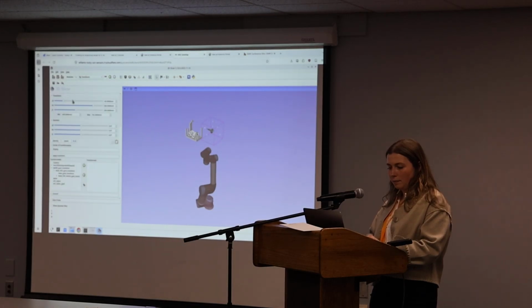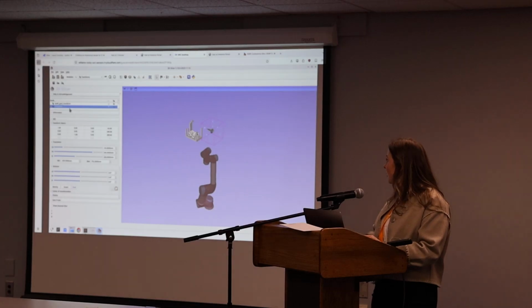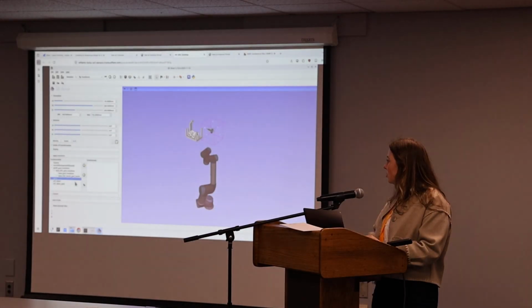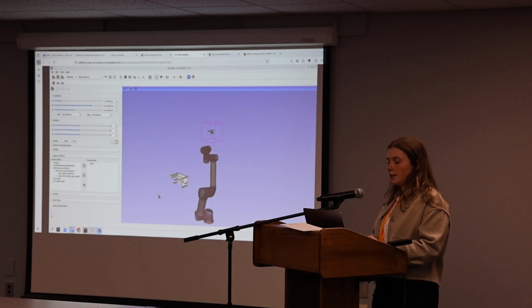Transform. Okay, so we already have a transform in the scene. You can just apply the spine to it. So you go to the transform module and you click on transform up here, and then you scroll down to have this, and you can just press this little arrow next to spine, and that will actually move the spine already into the scene.